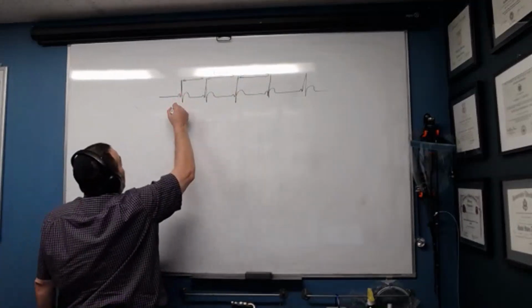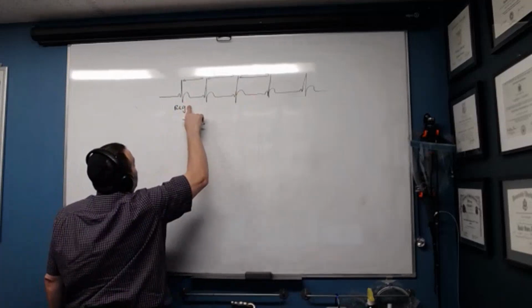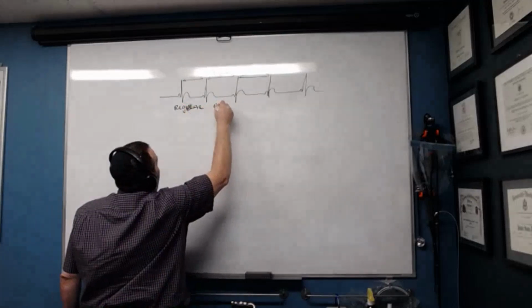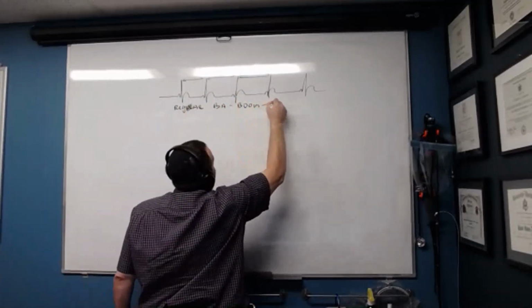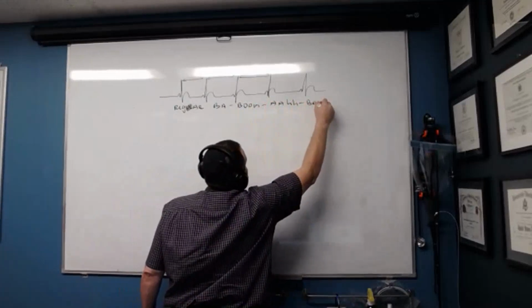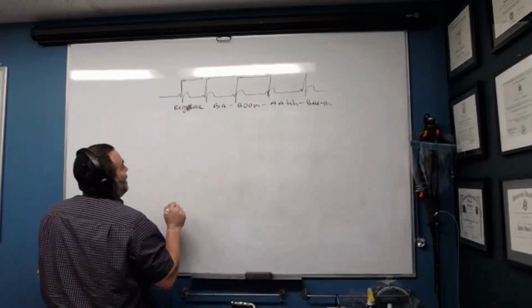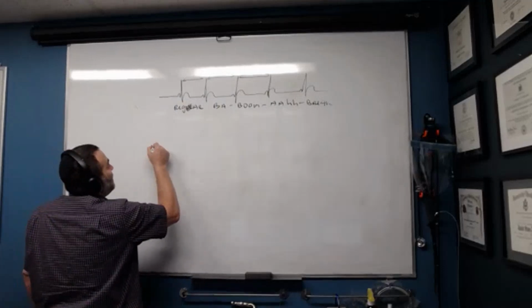So if this is your up on top regular, oh boy, regular ba, boom, ah, and break, that's your regular. Everything is regular. Now watch this. How is this different? How would you sing this out?